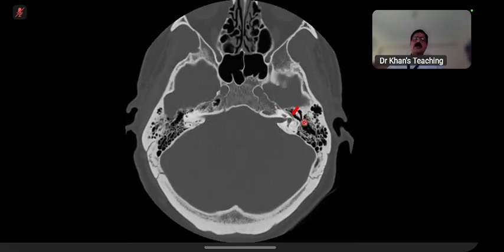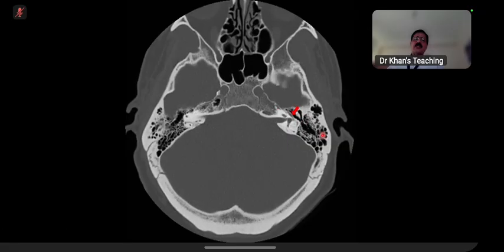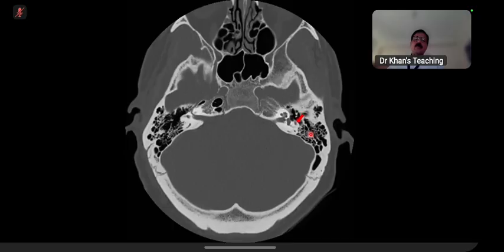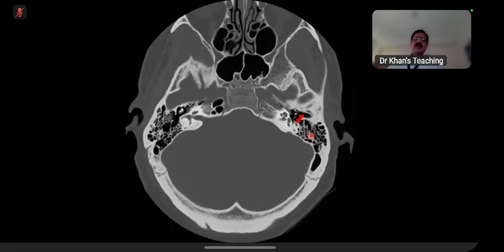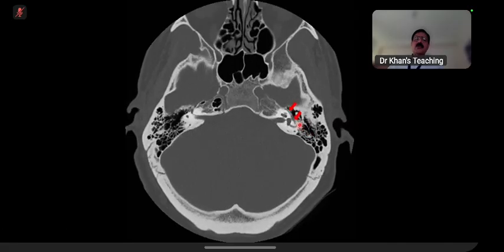So coming back, please remember we are learning through the facial nerve. So the facial nerve, this is the tympanic portion where the arrow is, and you can see it becomes a straight line. I'll go up. So this is the lateral semicircular canal, and you can see how it is passing on this axial below the lateral semicircular canal till the time it reaches the mastoid, the posterior genu. Here, if you look carefully, you can see the stapes, and there are other structures which I'll point out in another series of diagrams. But right now, just concentrate on the facial nerve.